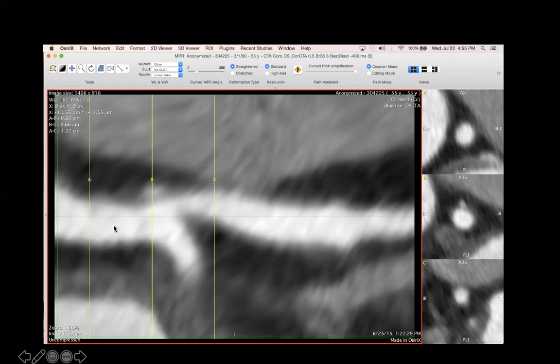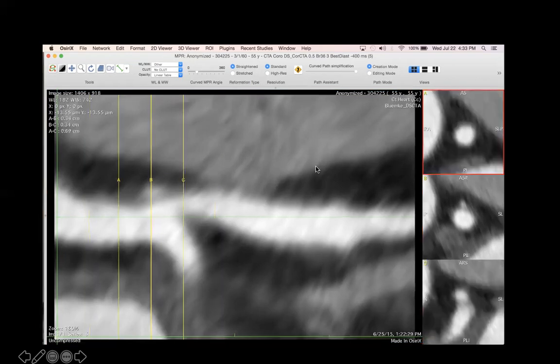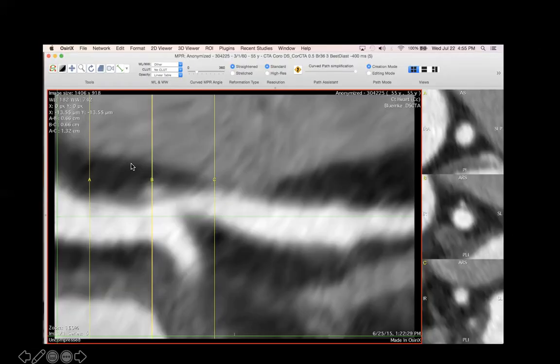However, so here's the left main coronary artery. If we look at A, this cross section is labeled A. That's up here, and it has a very nice wide open look to it. This is fat around the outside. Sorry, I went to the next slide here. So this dark signal is fat, this is blood, and this is blood in the coronary artery.